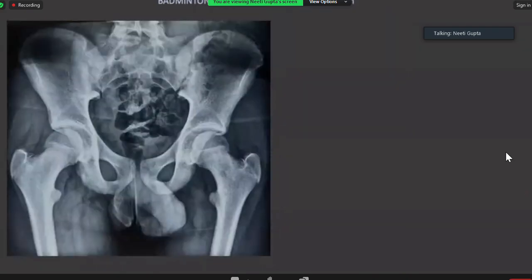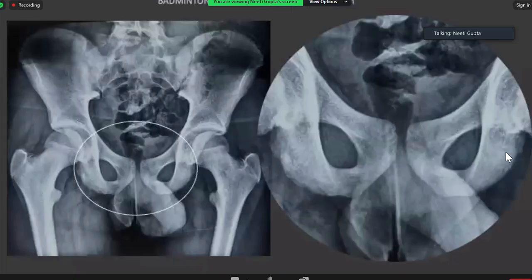So at first look, the radiograph might look apparently normal, but with a chronic history of right-sided gluteal pain, you are now able to appreciate this subtle cortical irregularity at the right ischial tuberosity. With the history of gluteal pain and these imaging findings, you should suspect an apophyseal injury of the ischium at the common hamstring tendon origin. One of you commented it as an avulsion fracture. There is no displaced bony fragment here, so I would call it apophysitis rather than an avulsion fracture.